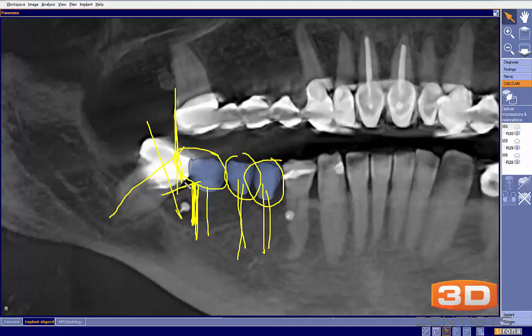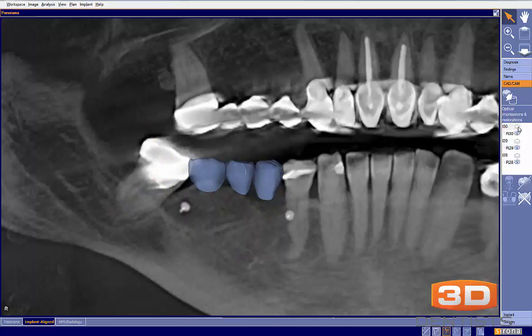So that would be one thought process I would have. Certainly the patient would have a great role in determining that, but from a cost perspective, we're still looking at 3 implants and an extraction versus 3 individual implants with small teeth. And then if we were to ever lose this tooth now, we'd never have to really put anything back here because we simply redistribute the spacing.